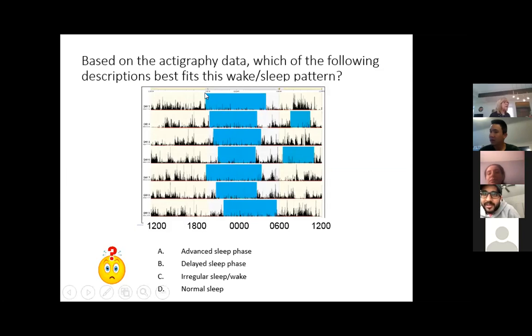So generally around 7 p.m. or so, 7 to 8 p.m. Yeah, I would assume. What time is he waking up? He's waking up around 3 or 4, and then I think the morning bits are just naps because he's tired, potentially. Yeah, yeah. So this is a great old person advanced sleep phase.